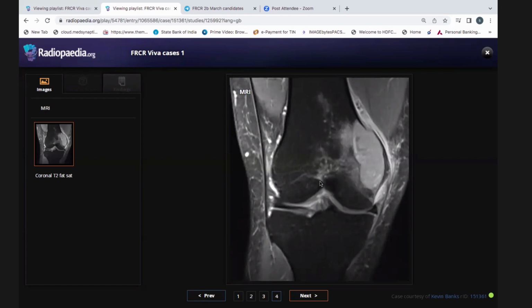I'm worried about osteomyelitis as well because of edema. I need to check contrast enhancement in my routine practice, to exclude the emergency and correlate with any clinical manifestation of the patient of inflammation or inflammatory marker. Also, I will recommend biopsy of this case.